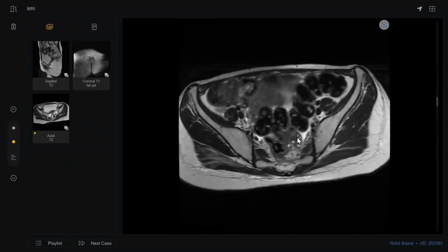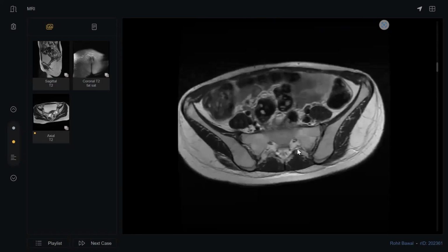So, in summary, in this patient with acute pain and fever, there is on ultrasound grayscale images enlarged ovary with the increased central stroma. And also there was no vascularity of the pedicle on the Doppler ultrasound. And on MRI, there is fluid surrounding the ovary with again enlarged left ovary. This is a case of left ovarian torsion which needs urgent management.